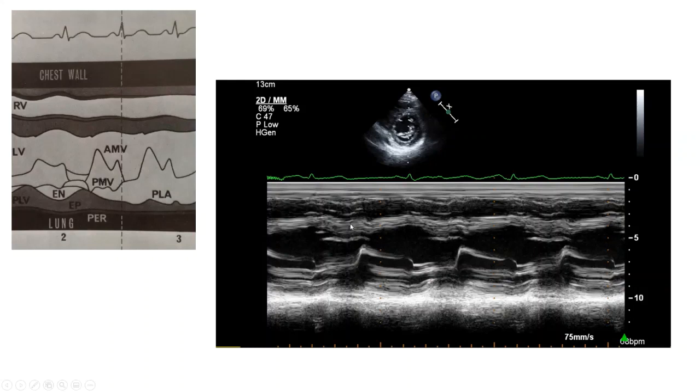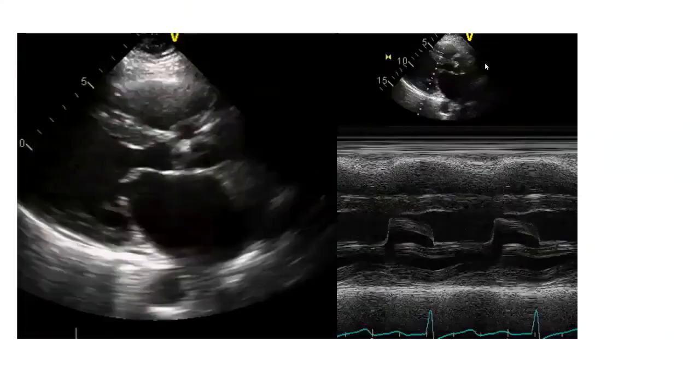Well, compared to the normal, what you're seeing is the anterior and the posterior leaflets are thickened. They're not the nice, thin, pliable leaflets that one sees in the normal situation. And they do tend to ride together as opposed to this mirror image, double diamond appearance. These tend to ride together. This is what is seen in rheumatic mitral valve disease. And this patient is still in normal sinus rhythm, but when you see these leaflets moving together, it indicates that there is likely some commissural fusion.